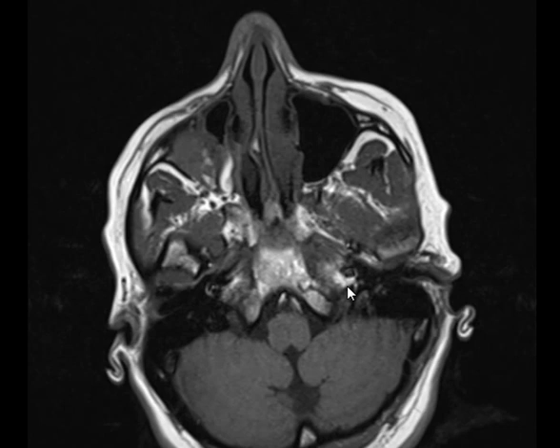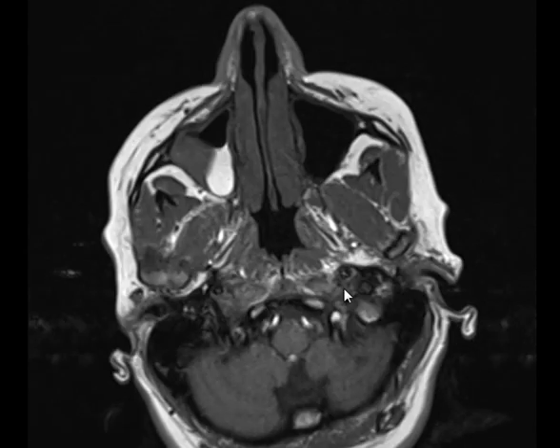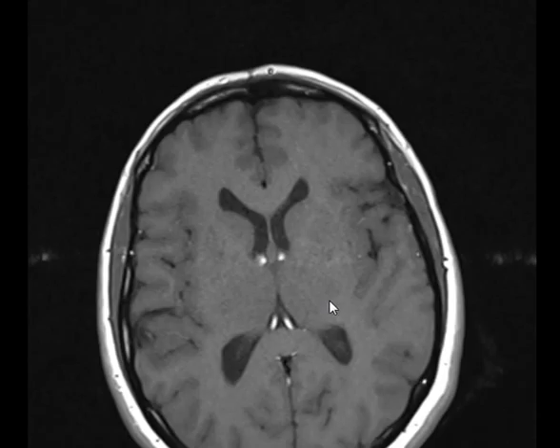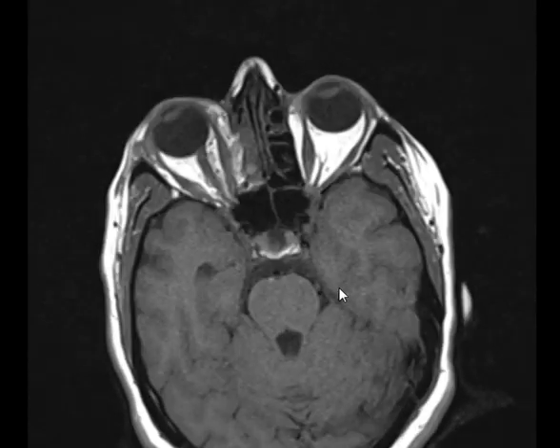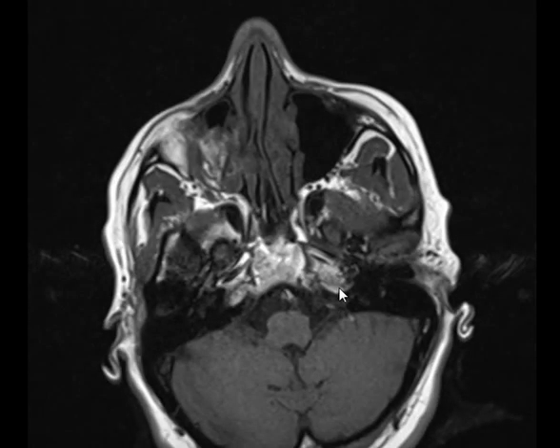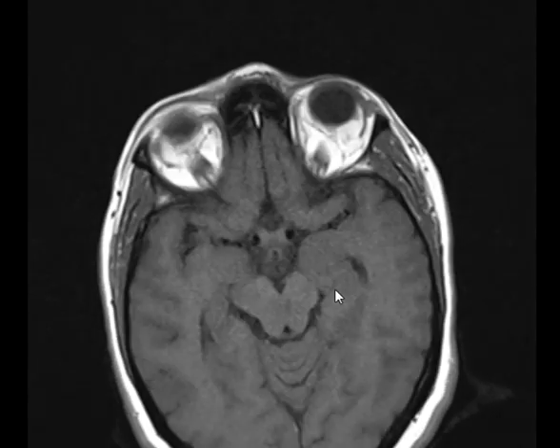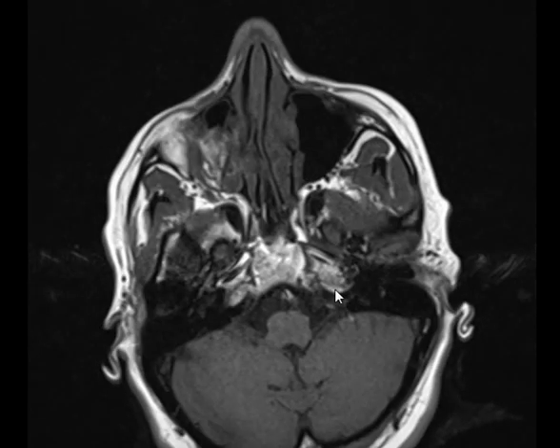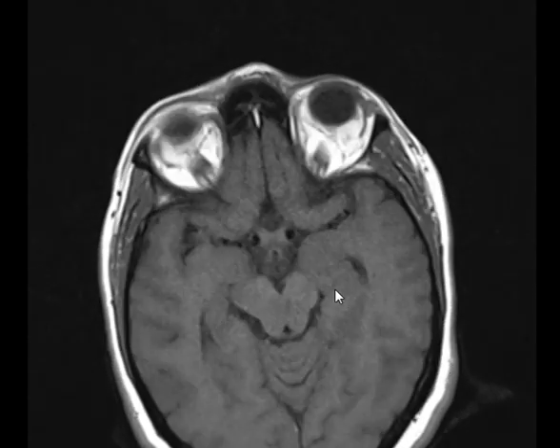Of the brain, you should see the brain to its end. No, we are not here. Stop. So this is an MRI of what? Of the orbit, exactly. Given the clinical history, it's of the orbit.